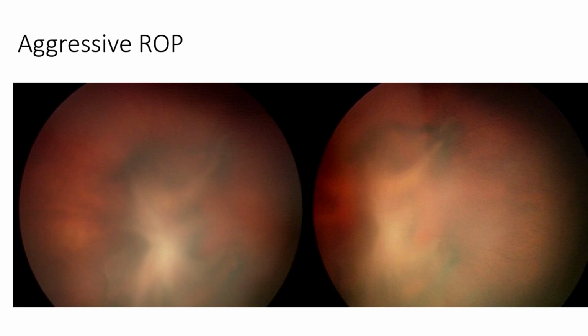Because the retina is being pulled so much, the RPE, which is one of the first cells to get developed when the eyeball is formed, shows that the traction is slowly developing as the eye is developing. So this RPE you can see undergoes hyperplasia and you have really thick lines. So this shows that there's so much traction in this eye already. Rapid evolution of a disease. That is aggressive ROP. The traction has also started developing. And there are retinal folds.